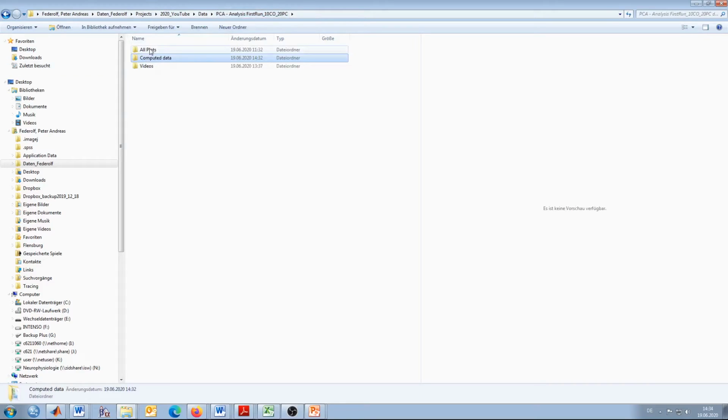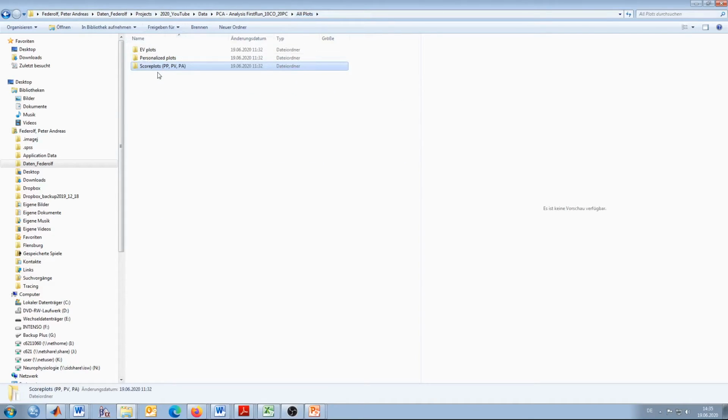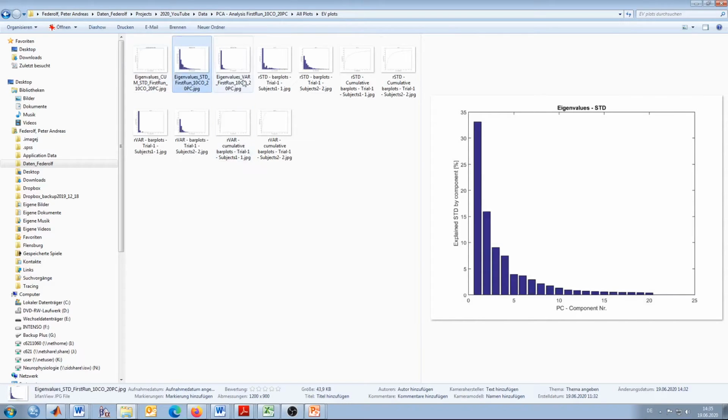If you go back, if you are looking for plots that you want to generate, then you find that here. These score plots I didn't select in the calculation, so it's not empty because there is something from a previous run through, but what we calculated here are these graphs that you may recognize that they briefly showed up when I executed the PManalyzer.